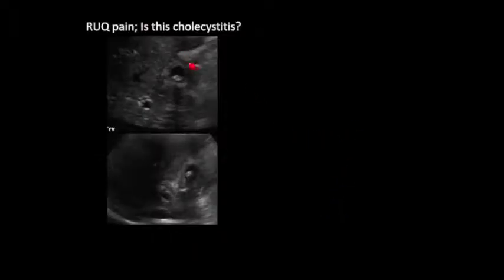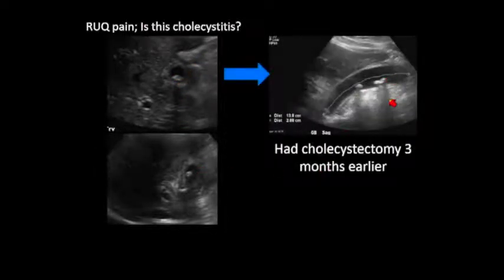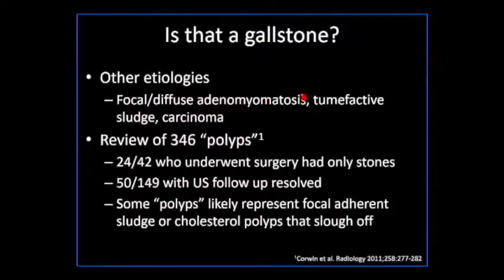And equally as much this one with right upper quadrant pain. There's a little fluid collection with something that's shadowing. This was what the gallbladder looked like 3 months earlier before it was taken out. And every now and then a stone gets dropped in the gallbladder fossa and a little fluid can accumulate around it. And both ultrasound and CT, it can almost simulate a gallbladder. So how about even, is that a stone? Did we get that one right? Well, you know, there are other things that I've shown you already in the gallbladder in terms of adenomyomatosis.